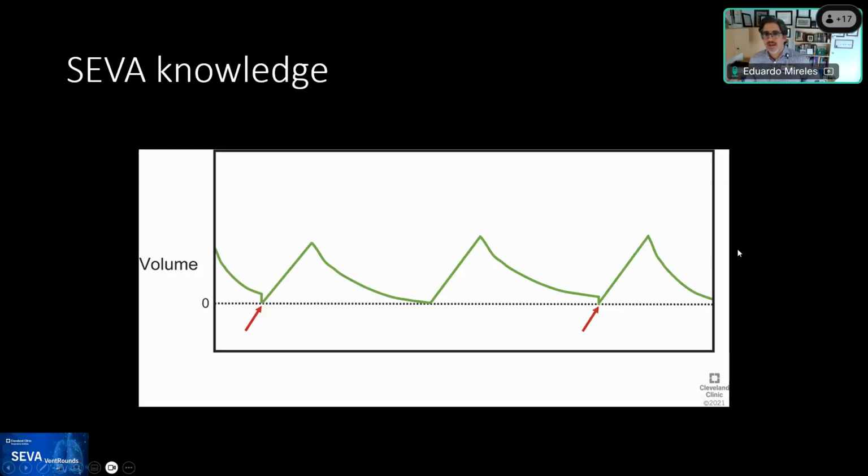So this is a classic graph where we usually focus on the waveforms for pressure, volume, and flow. But the volume waveform also has a fair amount of information, and there are a couple of items that we want to highlight to you. The first one, you probably have seen: there's the baseline for volume. This is in milliliters of air that the patient has received, and you can see how the volume increases, in this case linearly, which means that the flow was constant.